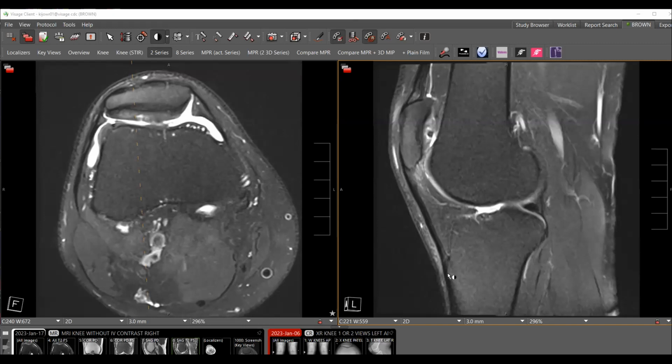Now, a flap tear is a fluid-filled defect within articular cartilage, which courses perpendicular to the superficial cartilage layer and then courses obliquely or tangentially through the transitional and deep layers of cartilage. Cartilage flap tears are important to describe in your dictated report because these cartilage flaps have unstable free edges along the superficial surface and may cause symptoms as the unstable free edge of the flap impinges against the opposing articular surface during knee range of motion.